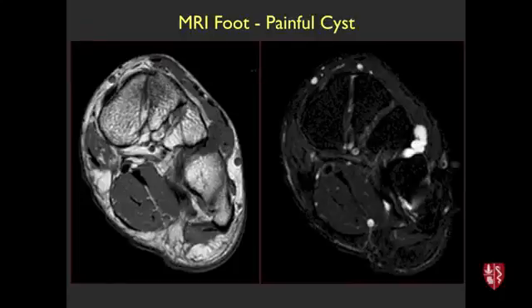imaging of the foot. So here's a T1 weighted scan and then a T2 weighted scan, and this white lobular thing is called a ganglion cyst that's coming out between bones here. And this patient had pain in the forefoot. It was one of our women's basketball players many years ago, and we used the ultrasound not to diagnose this cyst, but to guide a needle going into it to drain that cyst.